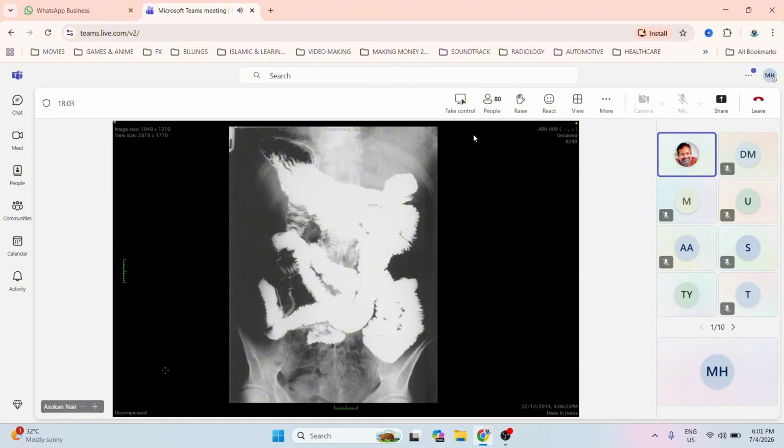Okay, so this is a fairly well demonstrated appearance of hidebound involving the small bowel. So this is scleroderma. You're right. Sorry, the image got flipped, but never mind.